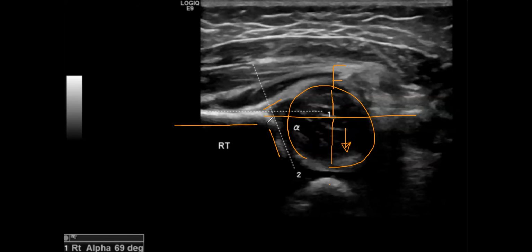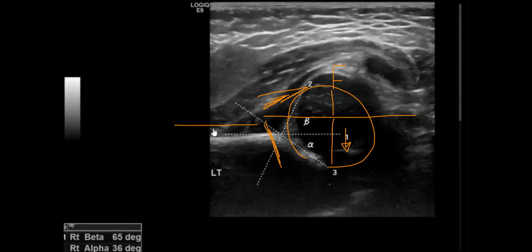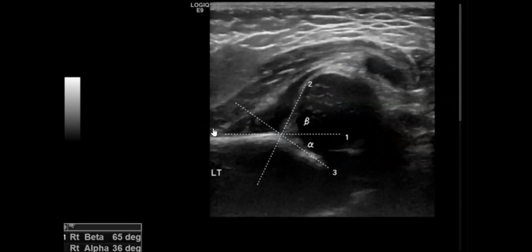Regarding the acetabulum, it's steep, normal. And regarding the labrum, it's triangular in shape, normal again. This is as a description. And now to the angle, it's a normal alpha angle, more than 60. Very good. But now I will remove this notation to write a new one.